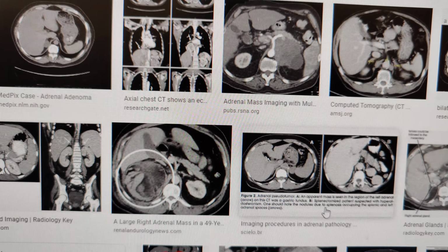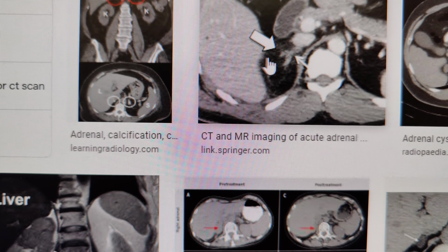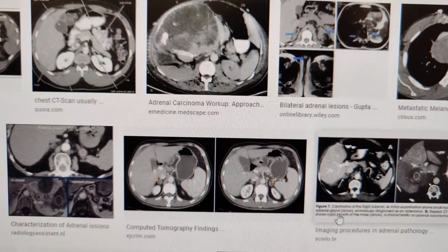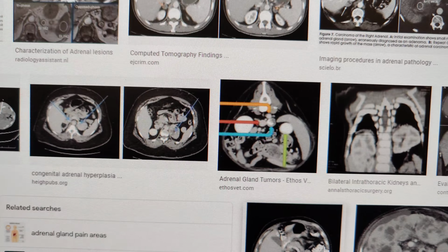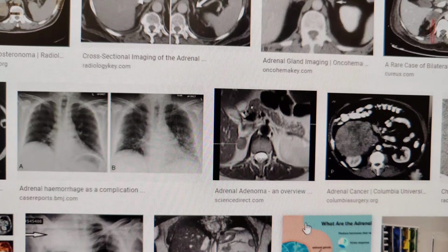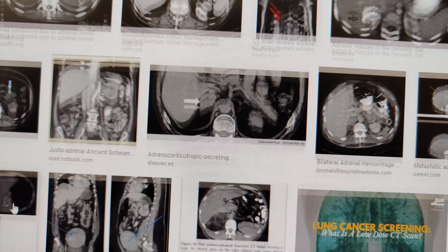The whole reason why we want the kidneys is specifically to look at the adrenal glands. So the adrenal glands sit right on top of the kidneys. So if you get the kidneys, you know for sure that you got the adrenal glands. And that's the reason why we get the top of the kidneys. So the easiest way to see an adrenal gland, because it's very, very, very petite, it's very small. Let me see if it kind of looks like a Y to me.